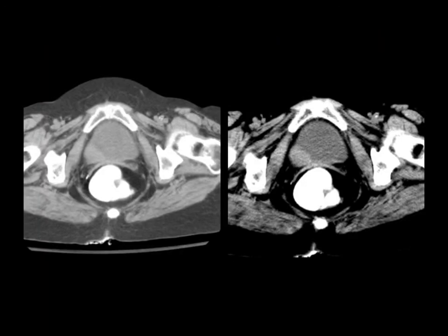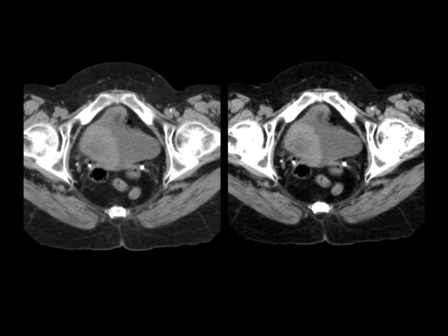There was a case I was asked to review of a patient who presented to the ER, different institution, with an acute abdomen, non-contrast study, positive oral contrast but no IV. And the radiologist read this as thickened descending colon, consistent with ischemic colitis, which is what the patient had. Patient had surgery, and despite a stormy course, the patient did well. What the radiologist didn't see on that non-contrast scan was the patient had a mass in the bladder.